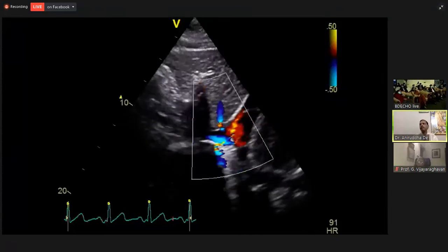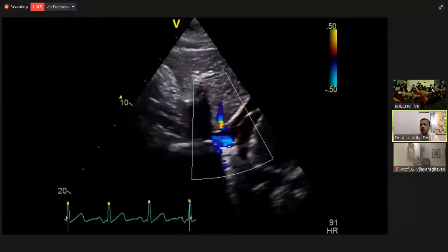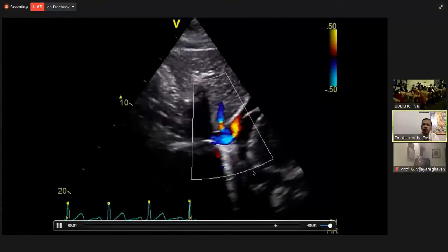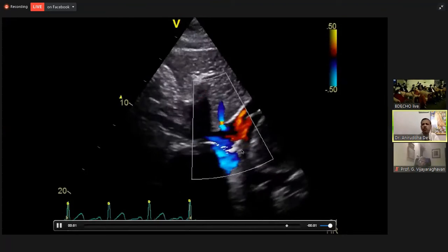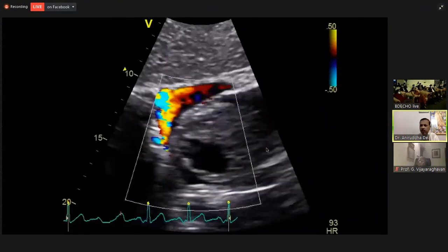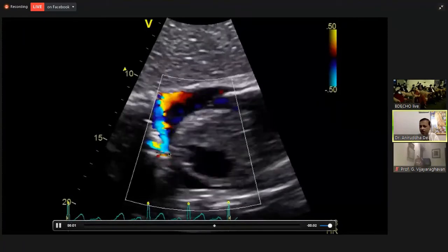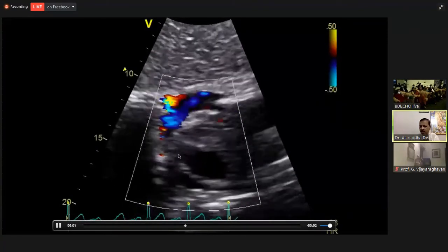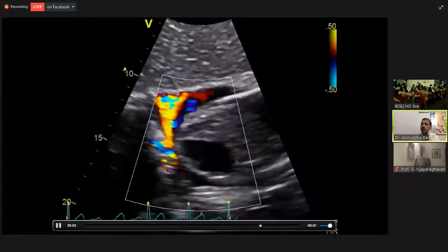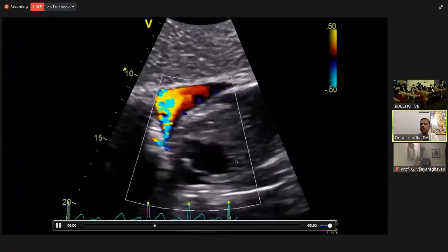But a very important thing: why did you miss this in the echocardiography? Why did you miss it? So looking at this, we reviewed the picture again. When you go to the subcostal view, we find there is some abnormal flow coming in the subcostal area. Now, if you zoom this area, you can see this is the aortic regurgitation, and some flow probably from the aortic region is going into this mass. You can see the flow inside.